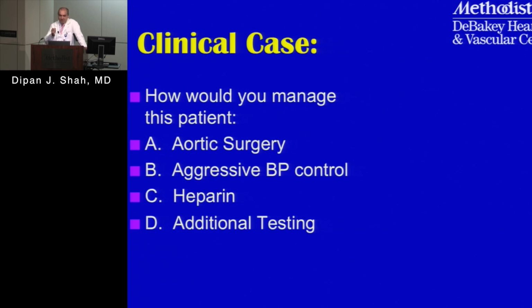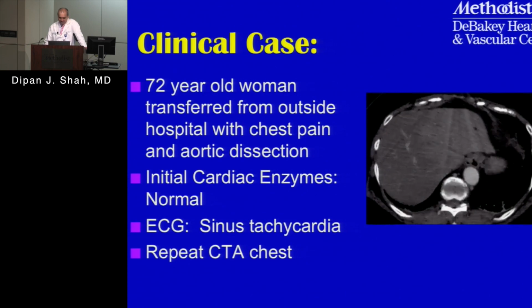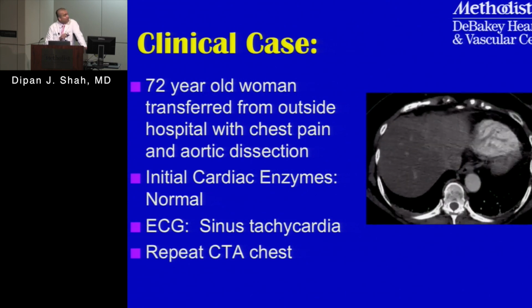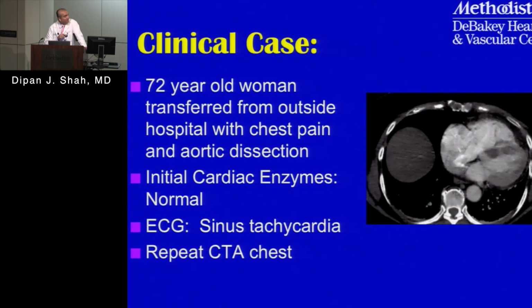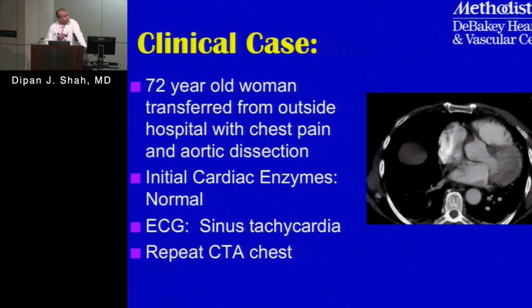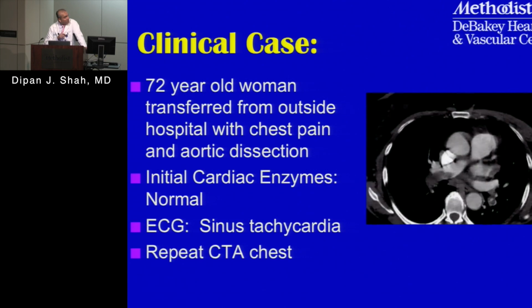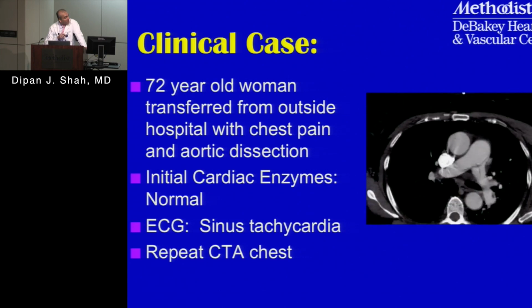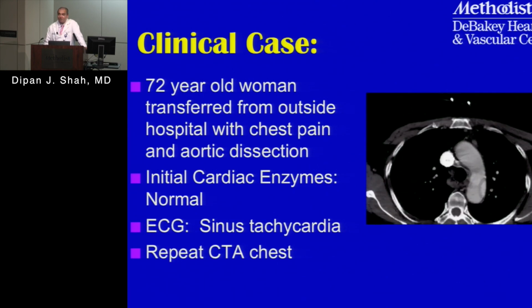So here's a question. Jeff says heparin. Why? Well, there's a lot of PE. Okay, so let's go through these images again. Not gated. Okay, I think it was a trick question. So you're concerned that there's pulmonary embolism, and that's based on the presence of filling defects in the pulmonary arteries as we get up here? Right there, right? Okay. Bilateral, right? You see one on each side. Okay, so you've got pulmonary embolism.